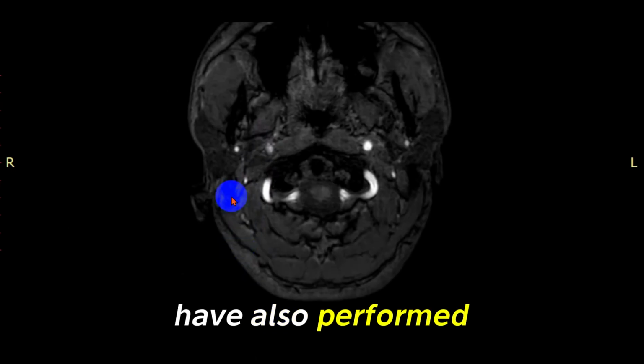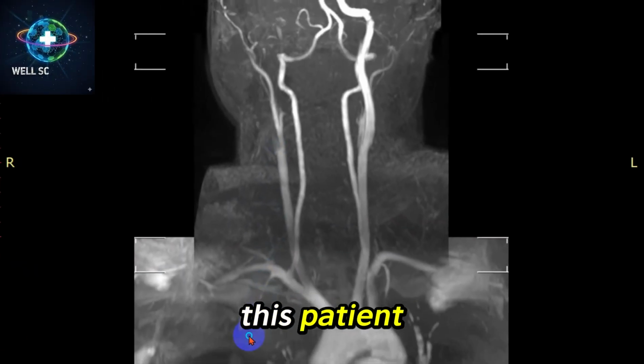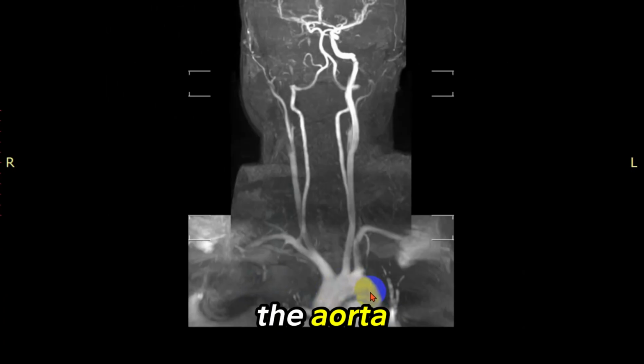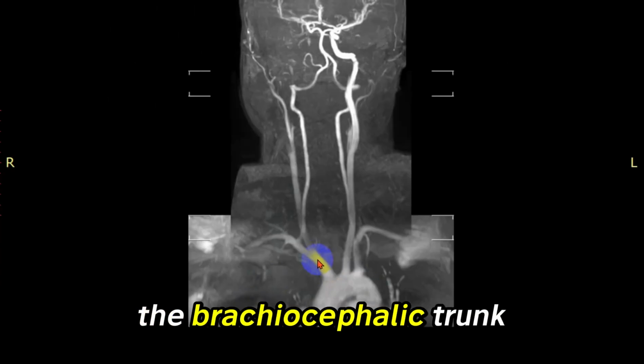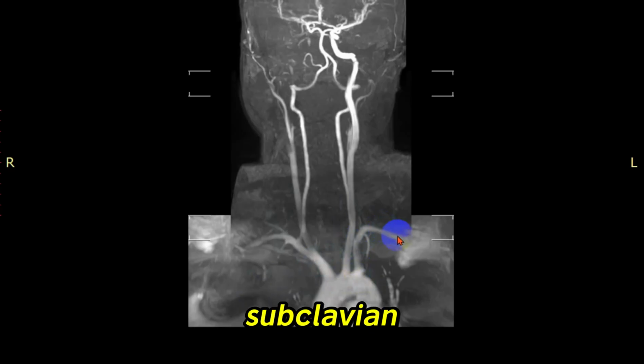We have also performed the MR angiogram of this patient. Look at this image. Here we can see this is the arch of the aorta. From here we know that three main vessels arise. This one is the brachiocephalic trunk, this one is the left common carotid, and this one is the left subclavian.